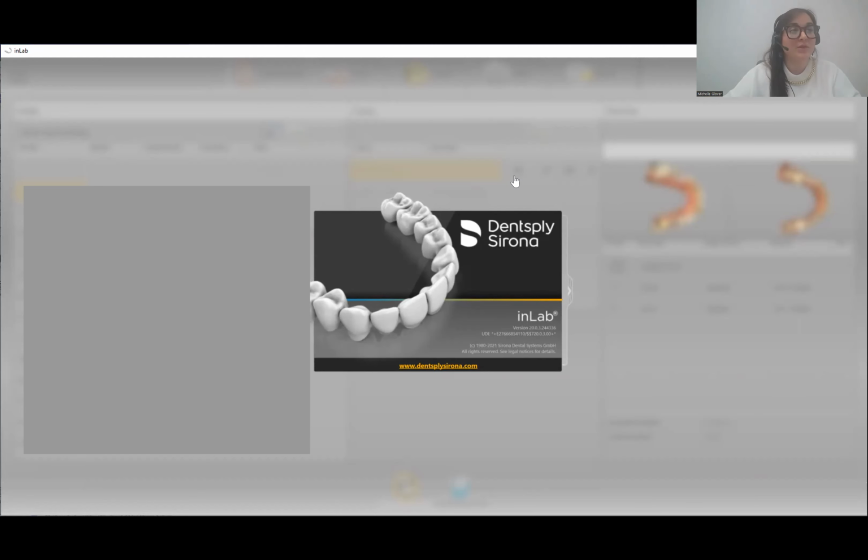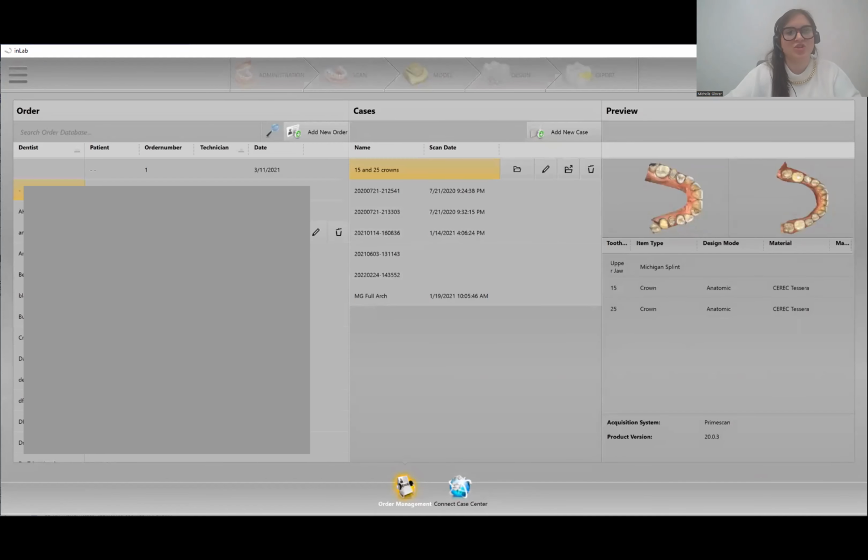Okay, now before we get started on that though, I'm going to stop sharing my screen for a moment, and I'm going to share the web page, because what we want to do here to start, if you haven't already, is create a new lab profile on the internet. Okay, so just going to open up here.